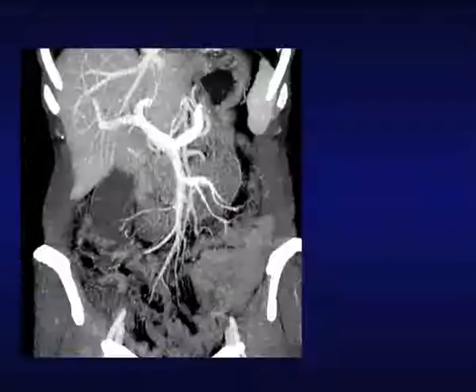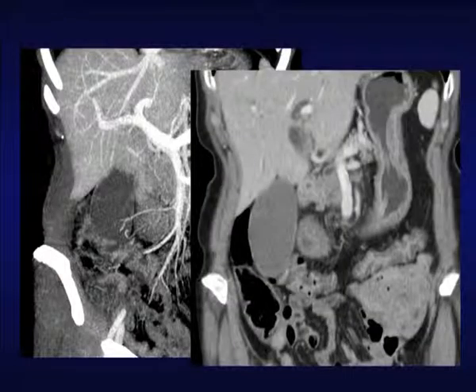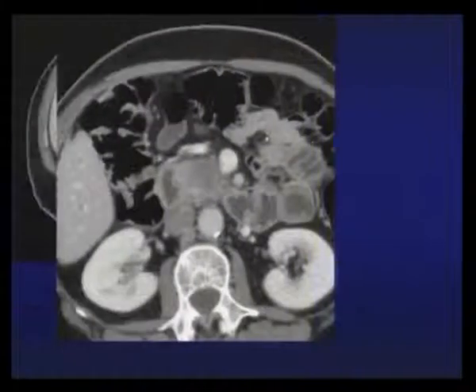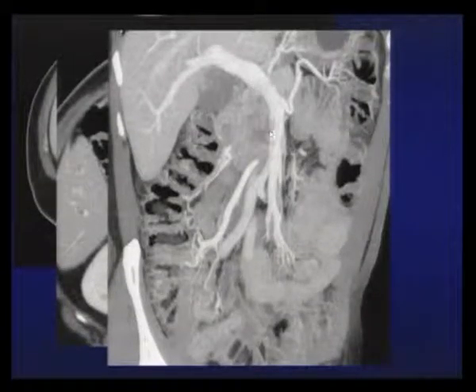And then another case, you see here a big cancer all along the superior mesenteric vein of the head of the pancreas, but also here we can see a thin fat plane, so this could be grade 0, grade 1, not more. And then this case is different. This is grade 2, grade 3. You see indentation of the right wall of the superior mesenteric vein and portal vein. We cannot always see the fat plane, so this is surely grade 2, grade 3.